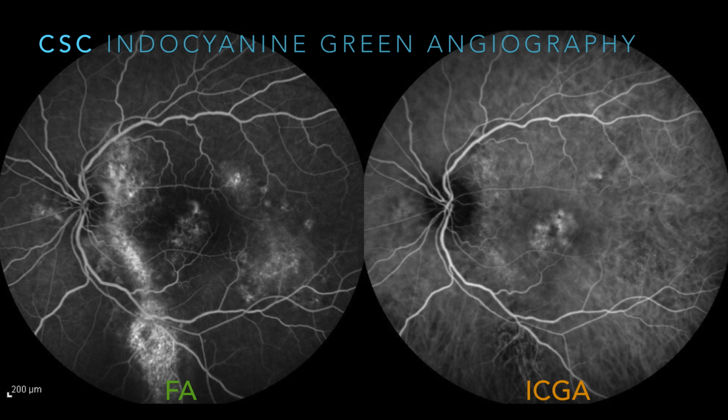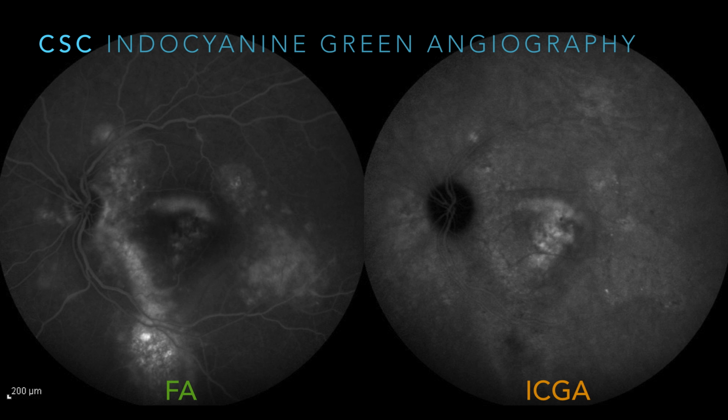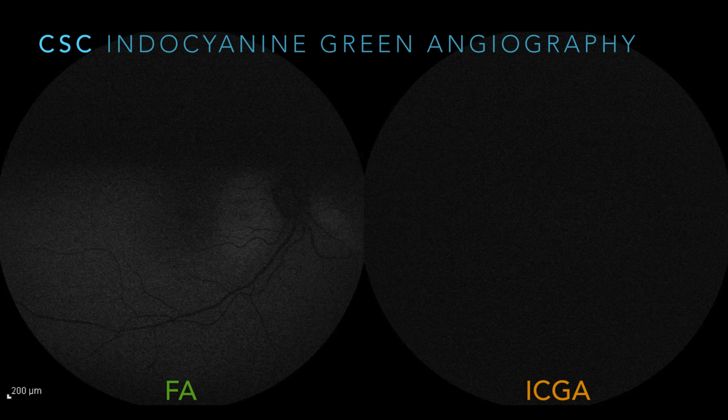Here's a patient I already talked to you about, who is type A, has obstructive sleep apnea and GERD. This is a recurrence of subretinal fluid. We did this scan prior to his therapy so I could take some measurements. His fluorescein shows that guttering. ICG is already showing some hyperfluorescence, and here it's a little bit more prominent. I would call this intense hyperfluorescence on the ICG centrally. And here's his late image at 14 minutes. He also has a smokestack on the FA, by the way, and that smokestack showed up on the ICG as well.